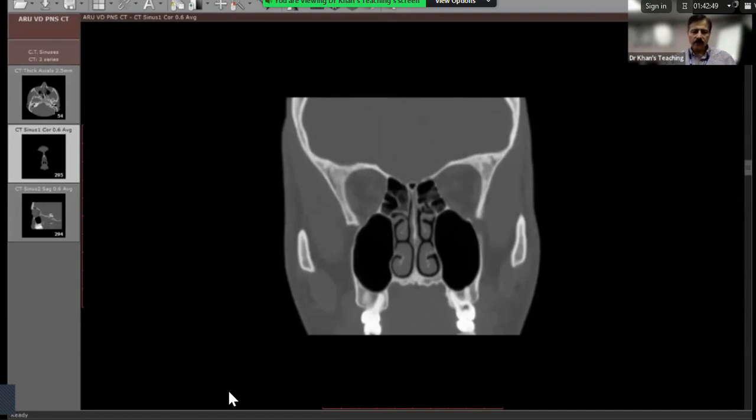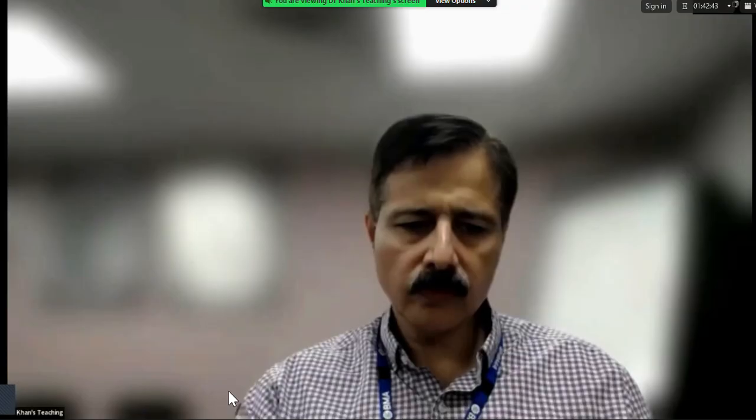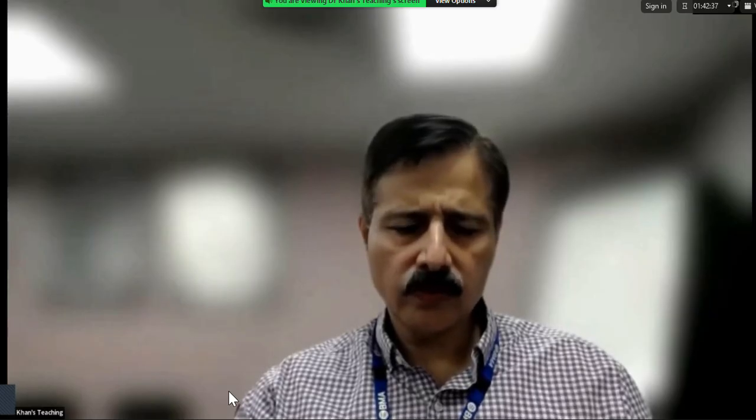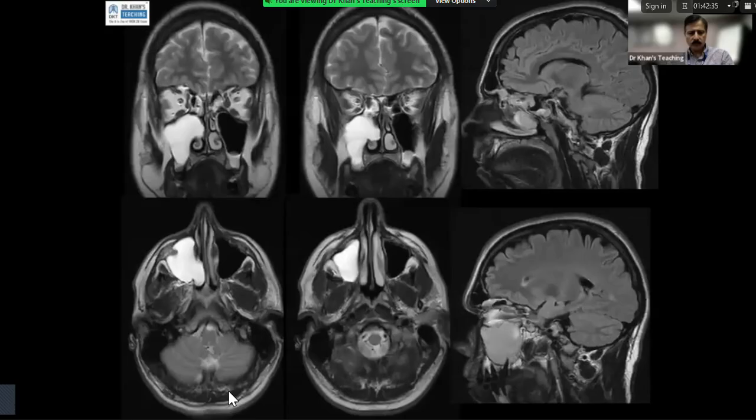So let's, from here, go to a few viva questions. So if you see here what is happening, let me go through it. What is happening? This is an antrochoanal polyp.